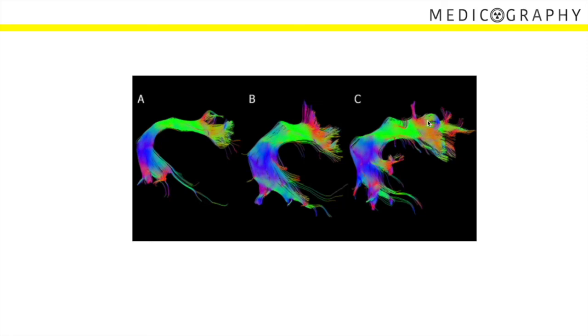And if you can see here on the B and the C image, the thickness and the tract of the arcuate fasciculus is longer. It's much bigger than the A image, which is the normal healthy patient. So I just want to say that DTI is not only for displacement and destruction because of a brain tumor or congenital abnormalities, but it can also explain neuropsychiatric problems, such as this.